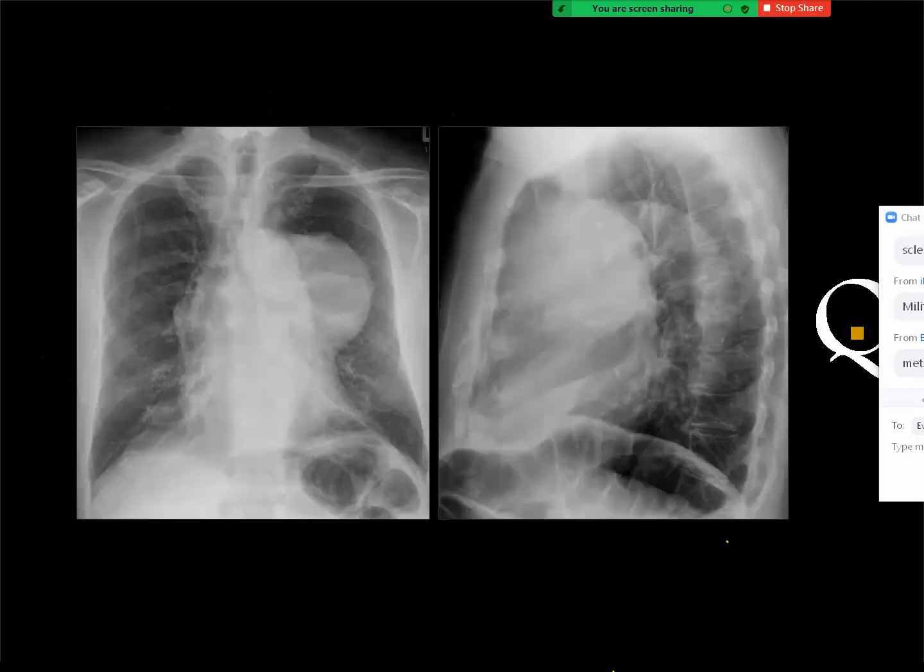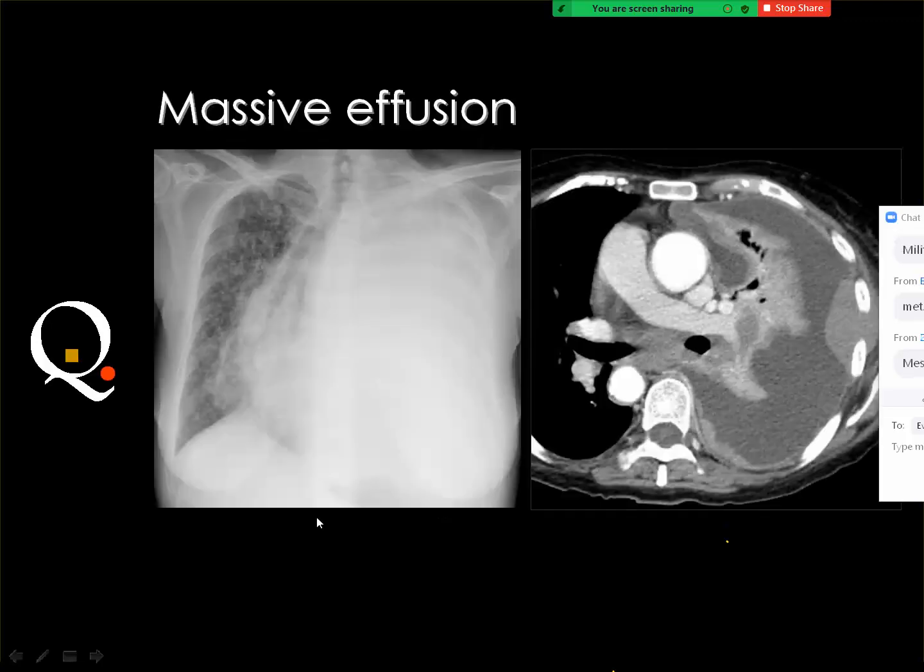Yes, and this is metastasis. Very, very good. These are metastatic deposits. You got a mass in the pleura and some masses here. This is not mesothelioma. I say many times, mesothelioma is a sheet of pleural thickening, non-uniform, almost totally encasing the lung.